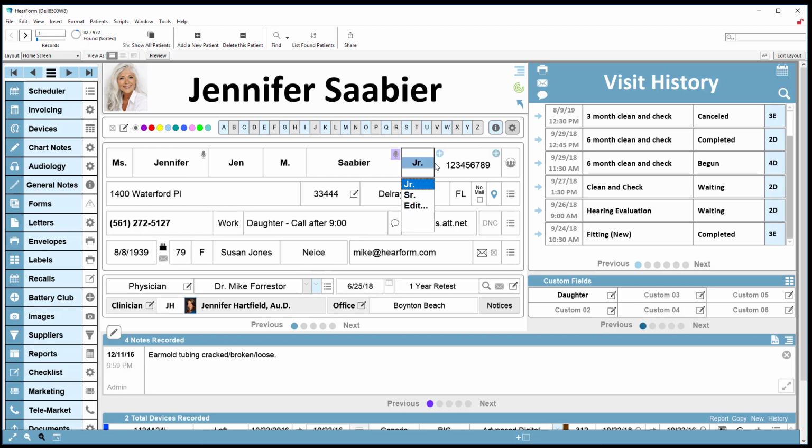This area is the medical record number. When I remove the numbers themselves, let's just remove it, you'll see the title of the field below it. As soon as I enter a number, then that title goes away, but then after a while you'll learn that that is in fact the medical number field.